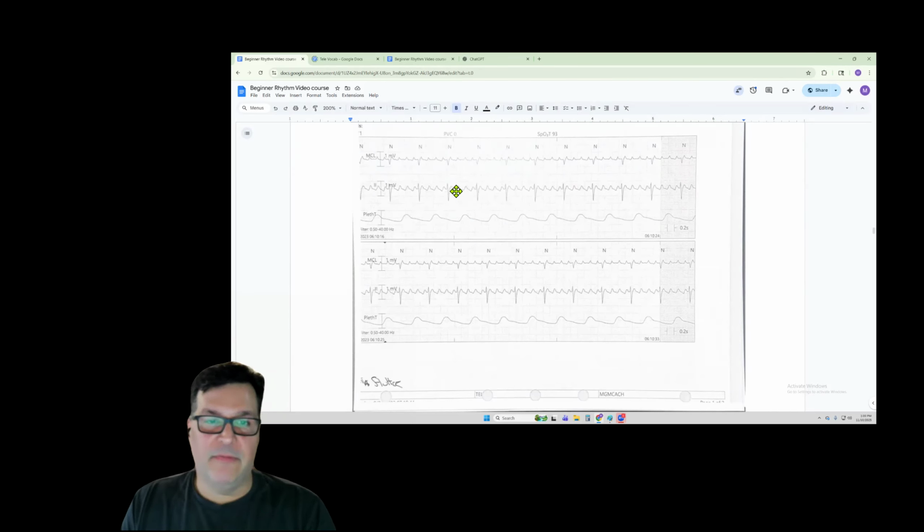So the atrial activity of flutter is going to be very regular, right? And the rate of that atrial activity is going to be right around 300, one big box. There'll be intervals like we talked about earlier, where it's a 4-to-1: 4 flutter waves, 4 atrial activities, 1, 2, 3, 4 to 1 QRS complex.